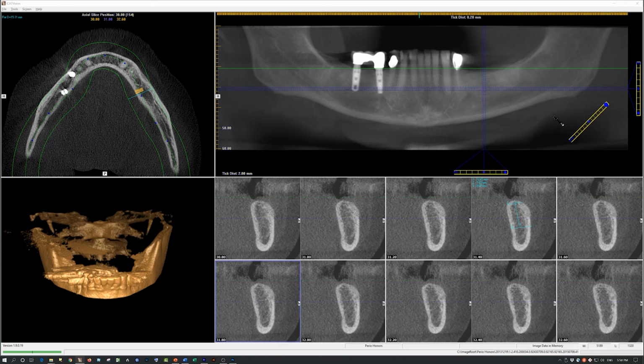So what can I do? I'll make this image slice a little thinner so that I can see the inferior alveolar canal a little better. So that's the superior border of the canal, and I'll go select from here, and I see about 12 millimeters. So this was also 12.4 and this is also 12.4. So the measurement is pretty accurate.